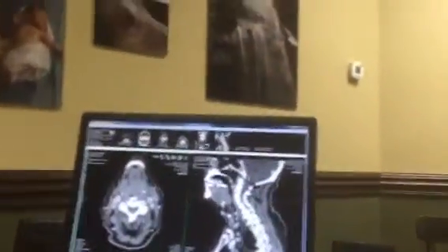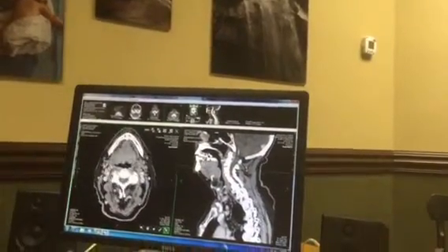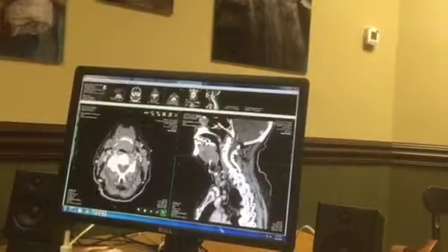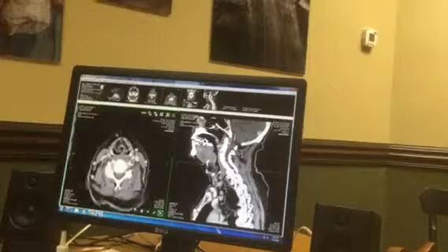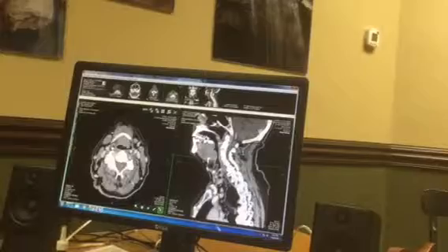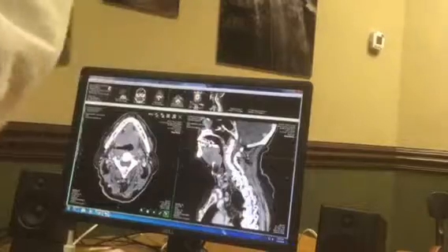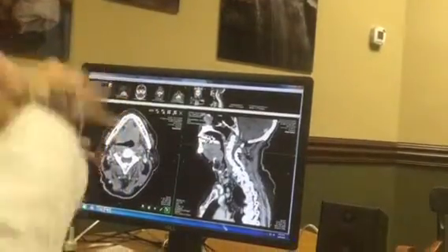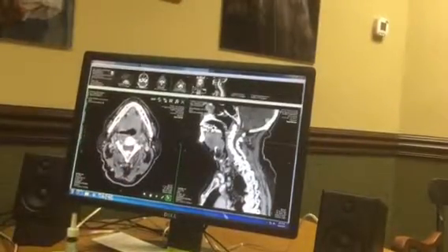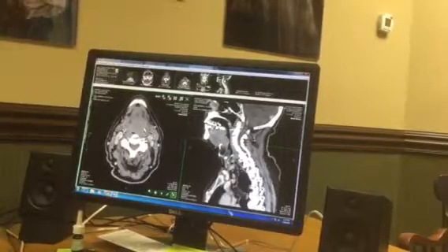So here's the jugular vein. Here's the carotid artery. This is the sternocleidomastoid muscle. And the reason you know that's a mass: if you look at the carotid artery and jugular vein, you can follow those up. They keep going up, up, up. You can trace them. See them? They're still there. Now trace them down. Now this thing pops up. You follow it, follow it, follow it. Oh, it's gone. That means it was a circle; you went through it and then it disappeared. That's how you can tell a solid mass from a cylinder. The vessels you can follow all the way down in the neck, whereas this little guy here, you can't.